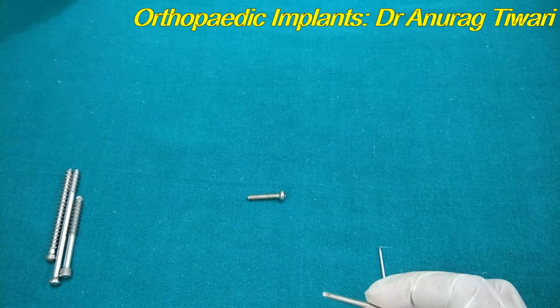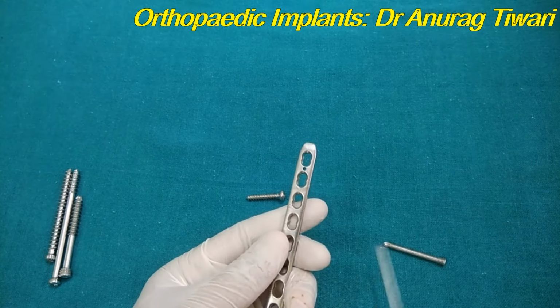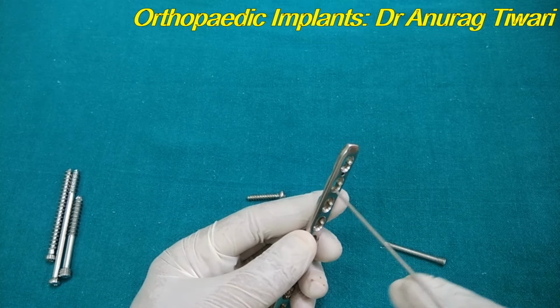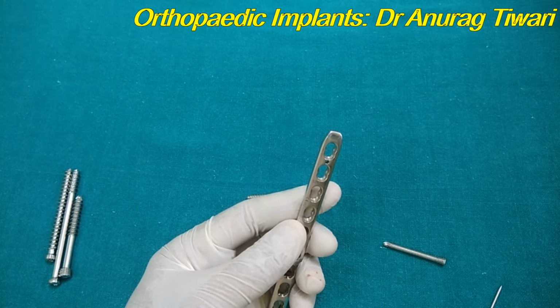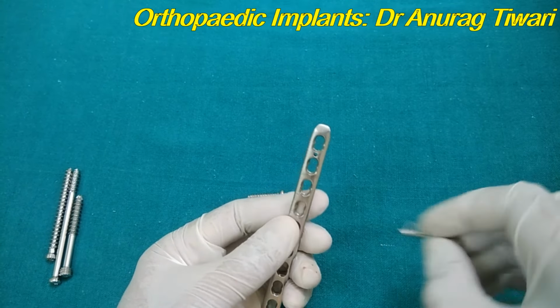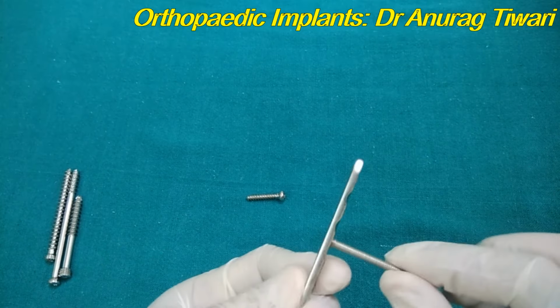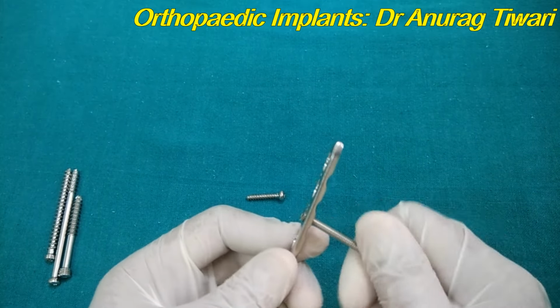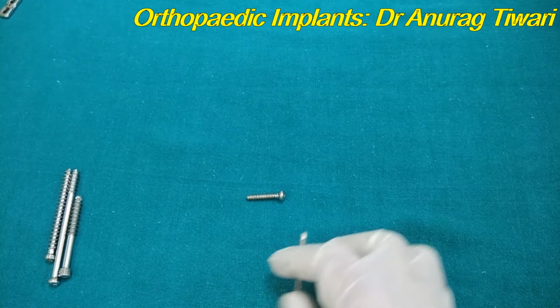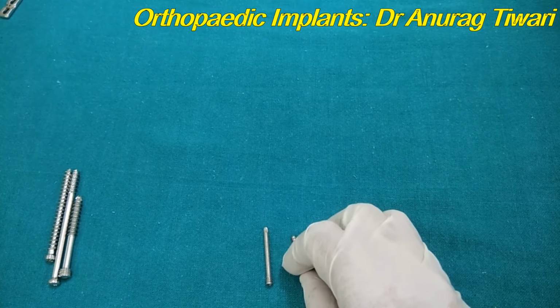So if I take any plate which is locking, the locking plate will have the threads over the hole also. Now this is the hole of the screw, and you can see that the screw can get locked in this hole. So the main purpose of the locking screw is to increase the strength. We will talk in detail when we cover the plate. So just remember the screws are cortical and cancellous, fully threaded, partially threaded, locking and the simple one.